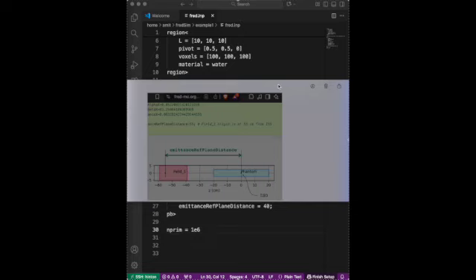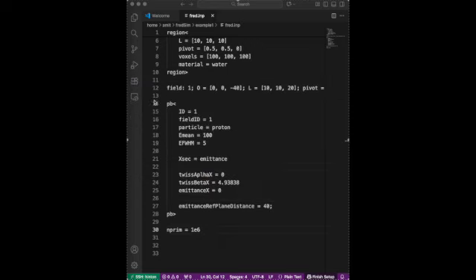I think it would be interesting what the plane distance would be when there are a lot of beamlets, if they're not originating from the same field width. I think they will take the average distance, and from there they can define the emittance reference plane distance. Anyway, I hope you get the idea of what this plane distance means.